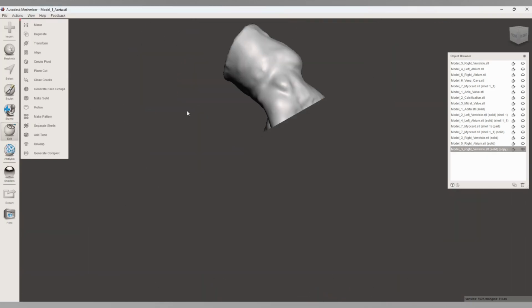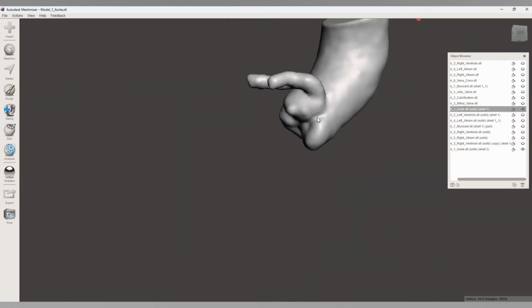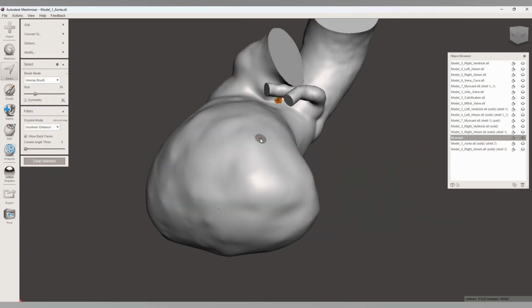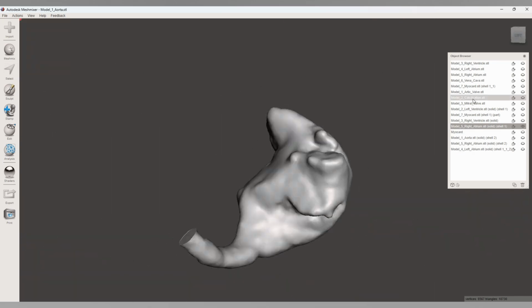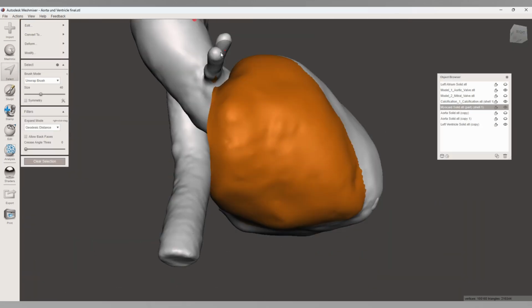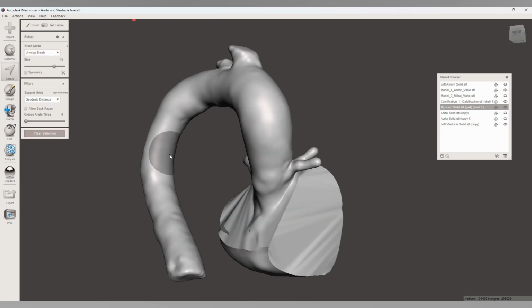planning and training. It's important to note that most of the segmented structures represent only the inner lumen of the heart's cavities. These cavities are made visible in the CT scan by the contrast agent introduced during imaging. While this provides a detailed view of the internal anatomy, it requires careful modeling to create an accurate and realistic 3D printable structure.